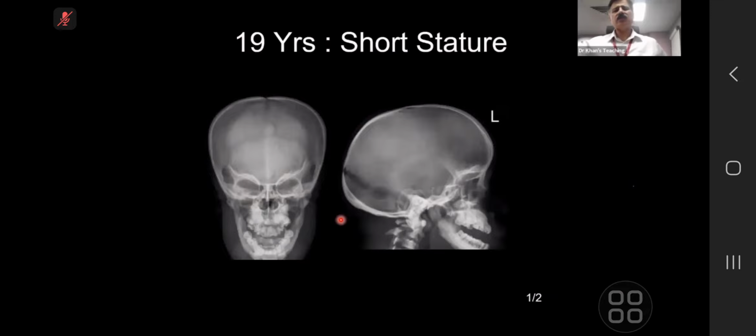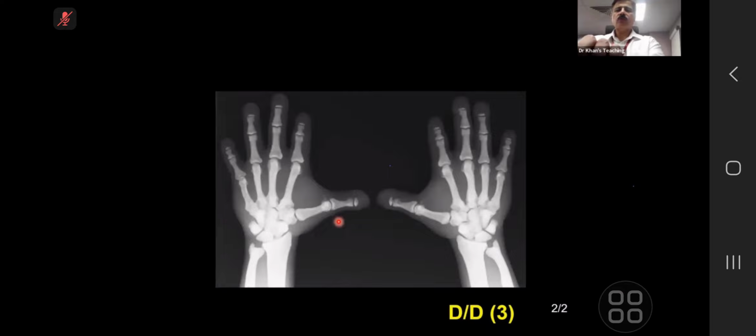Bone density in the exam is always slightly difficult to pick up at times because of projection, but the examiners are going to help you. So if you say that there is increased bone density and they tell you don't worry, then fine. Otherwise, they might help you. So the key thing here is that there is increased bone density. And otherwise, quite a few common things happen in pycnodysostosis, and that's why you can confuse it with cleidocranial dysplasia.